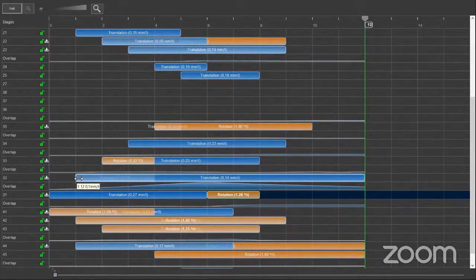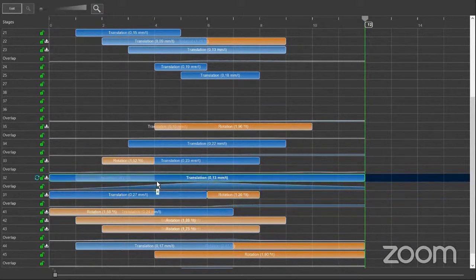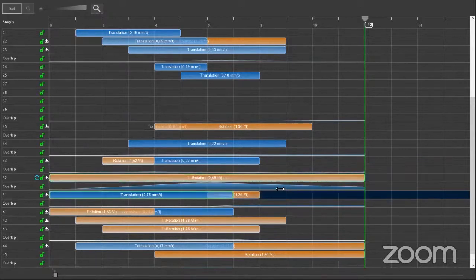So now it went back up here. So let's see if by putting both, I'm going to try one last time. And if not, we're going to do the interproximal reduction or the extrusion if it were necessary.